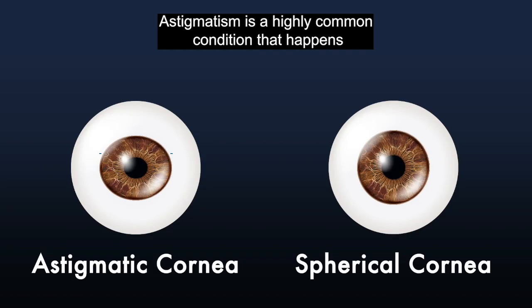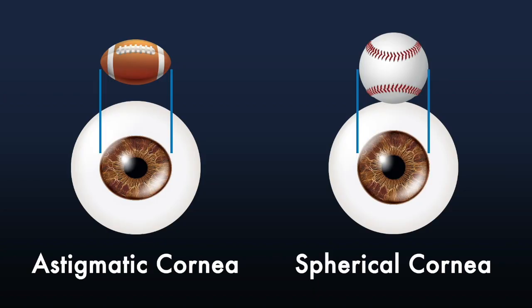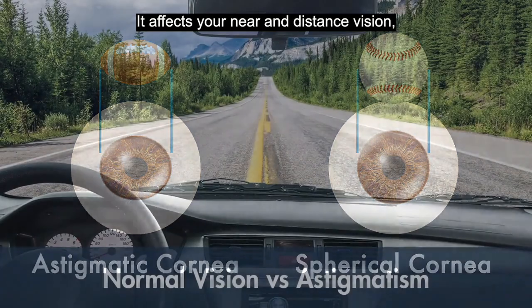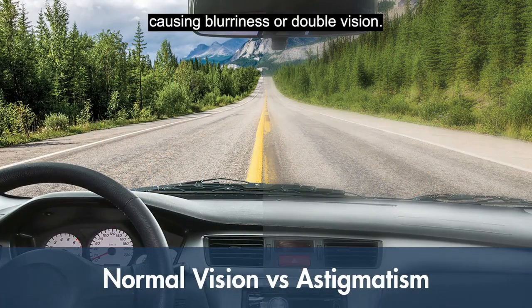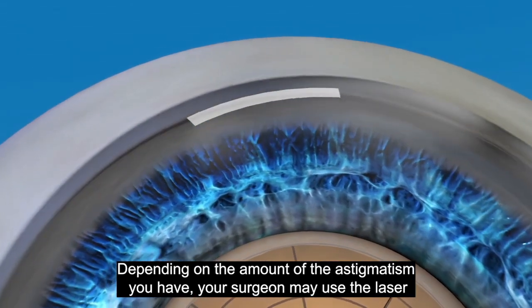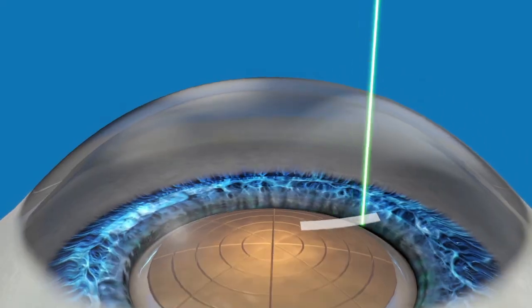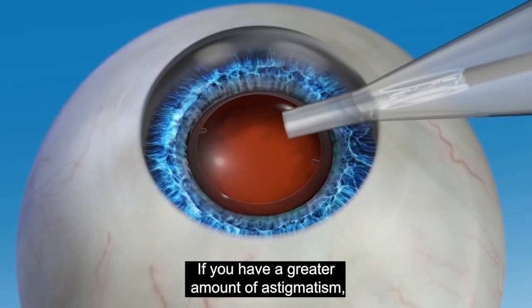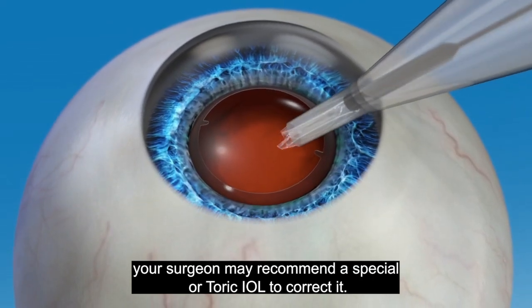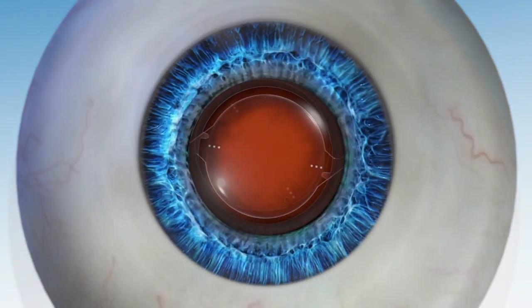An astigmatic cornea, if you see, is nothing but the corneal shape is like a rugby ball, while here it is like a baseball. And if you do not correct the astigmatism, the vision can be hazy. With the femto laser, we can correct the smaller astigmatisms up to 1.5 diopter, and if the astigmatism is more, then we need to implant a lens which is known as a toric lens, which corrects the astigmatism.